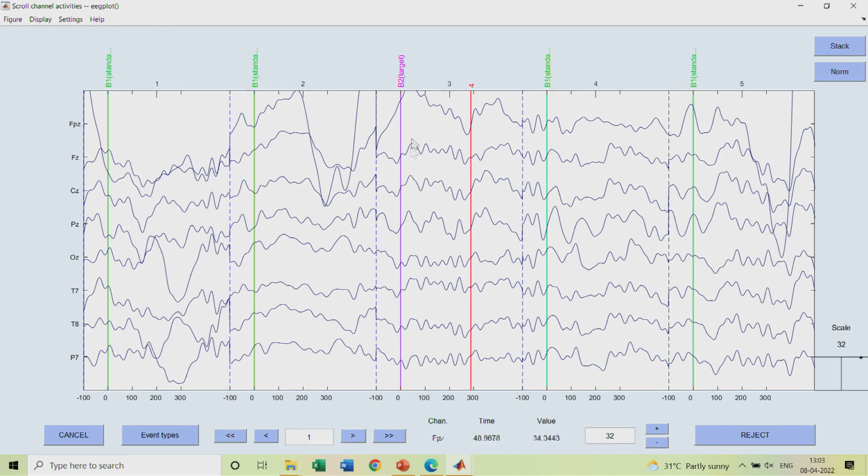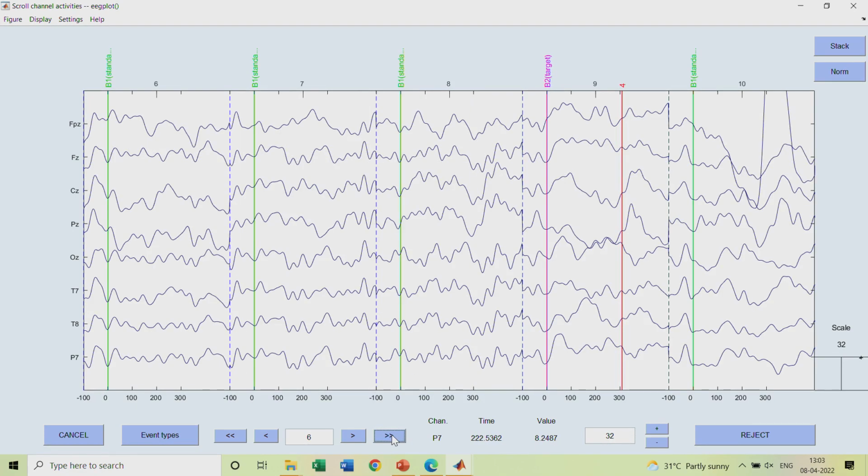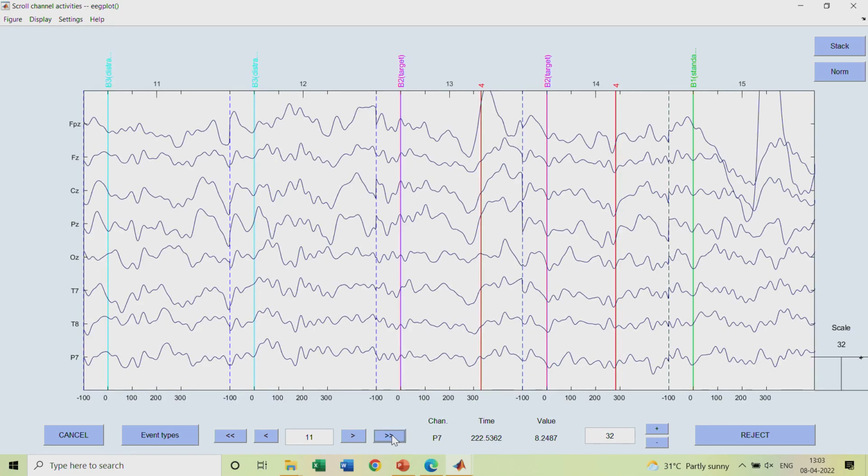Okay, I told you we are interested in 500 milliseconds after the stimulus, which might be somewhere here. Same thing you can see here, minus 100 and somewhere around 500 here, again minus 100, 500. So the time axis, which was continuous, has now been limited to minus 100 to 500, because that is the only thing which matters.